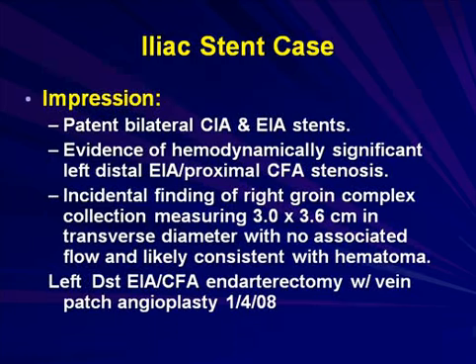Now, your report on this would be bilateral patent common iliac and external iliac artery stents with a hemodynamically significant stenosis of the left distal external iliac artery right at the origin of the proximal common femoral artery, and an incidental finding of that groin complex where we measured it with no associated flow and likely consistent with a hematoma. And this patient underwent an endarterectomy with vein patch angioplasty to address that lesion that we saw that was so stenotic.